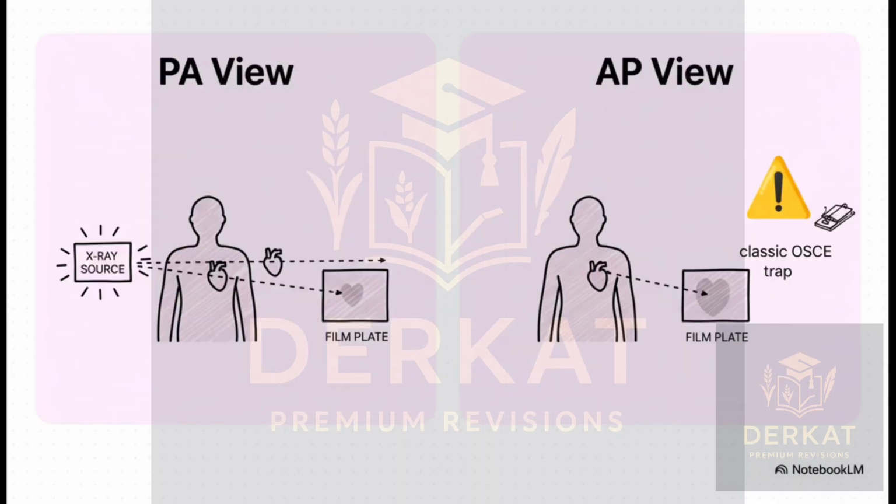Okay, P for projection. Now this one is a huge deal, especially for exams. A standard, good quality chest x-ray is a PA view, or posterior anterior, but for really sick patients who can't stand up, we often get an AP, or anterior posterior view. And here's the key difference, magnification. On an AP film, because the x-ray beam hits the heart first before the film, the heart's shadow gets magnified. It looks bigger than it really is. This is a classic OSCE trap, so always check the projection.